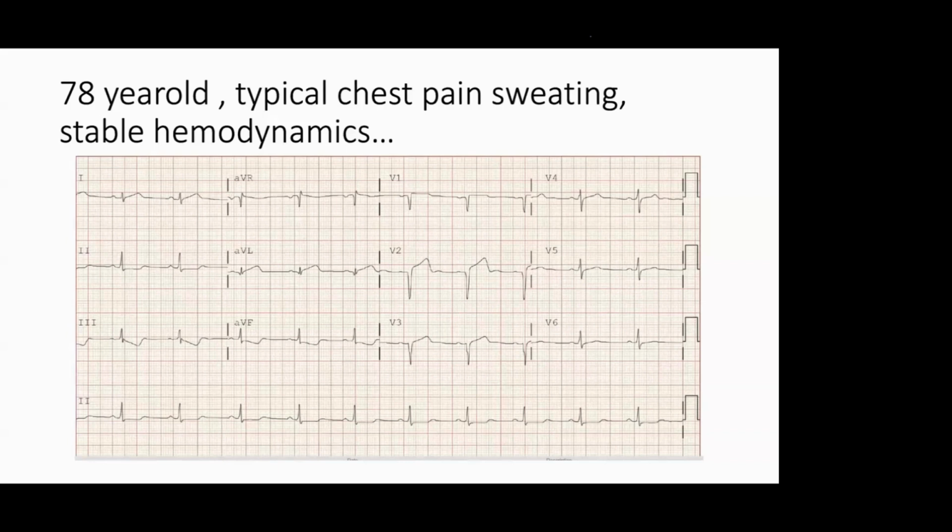So this patient, because T started inverting, this is like a Wellens pattern. In LAD STEMIs, 50% will recanalize. When they recanalize, pain will decrease and T starts inverting. So this patient will have some flow in the artery. At this point also, if they are complaining of chest pain, you can thrombolyze.